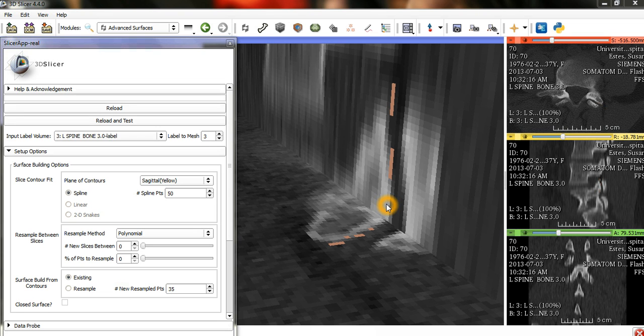Hey, Dr. Kane, just going to give you a quick update as to the facet segmentation here. The last time we spoke, you had wanted to look at a different plane segmentation. In other words, pick points off in the sagittal plane here.